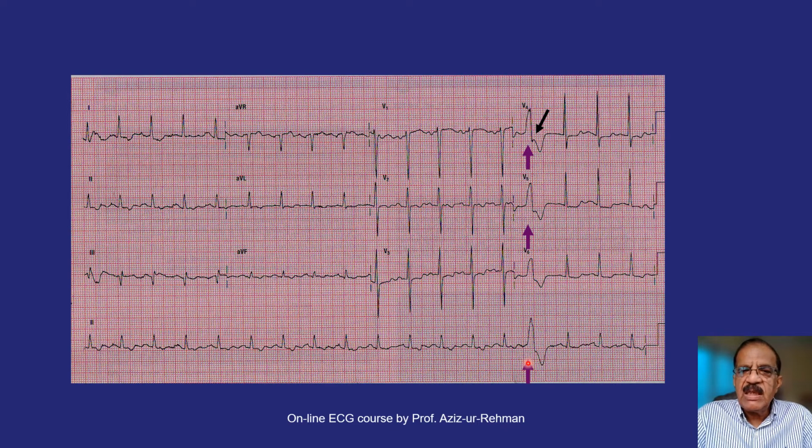But these small notches which follow the QRS complex but coincide with the expected P wave are normal P waves. In ventricular premature beats, since ventricular depolarization never goes back to the atria, as far as atrial rhythm and sinus node activity are concerned, it is as if nothing happened.